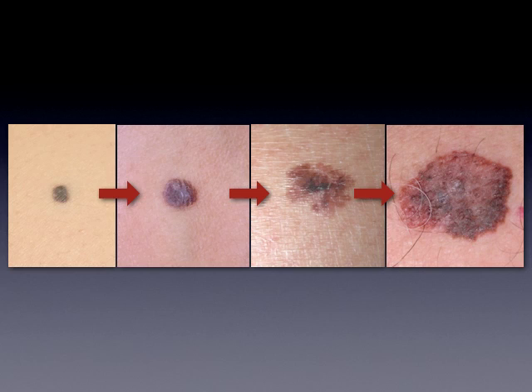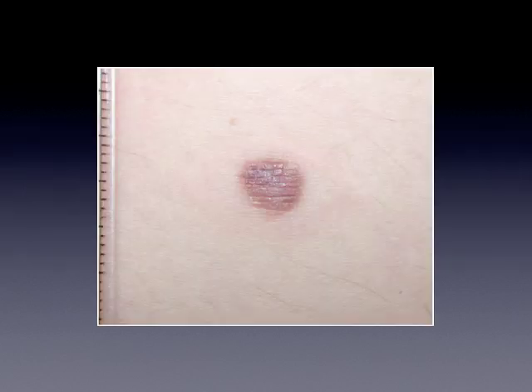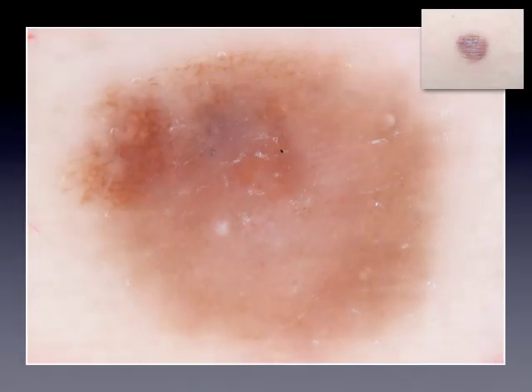In order to diagnose clinically a melanoma, we have to wait a little bit for the lesion to become large enough to have had time to develop the classic ABCD criteria, namely asymmetry, border irregularity, and color variegation. The great news is that using dermoscopy, we are able to anticipate the diagnosis as compared to the clinical examination, because dermoscopy can show very early criteria even in the context of small size melanoma.